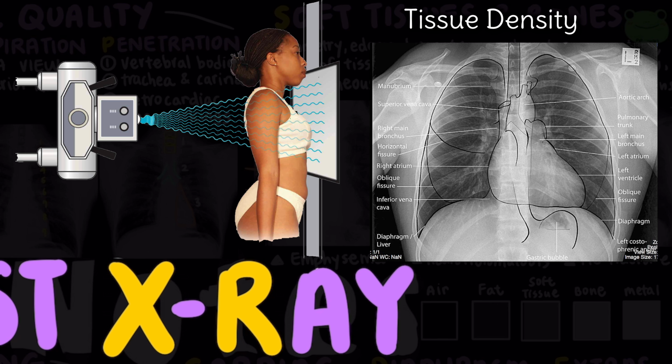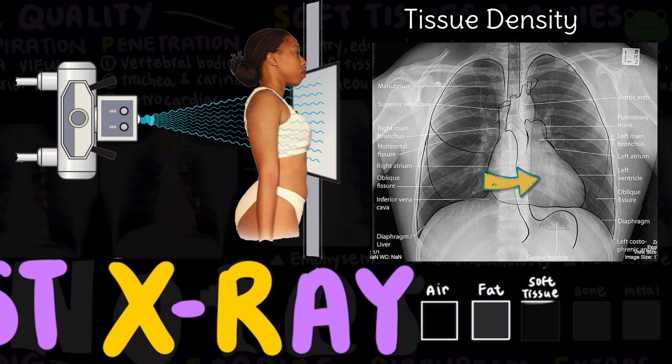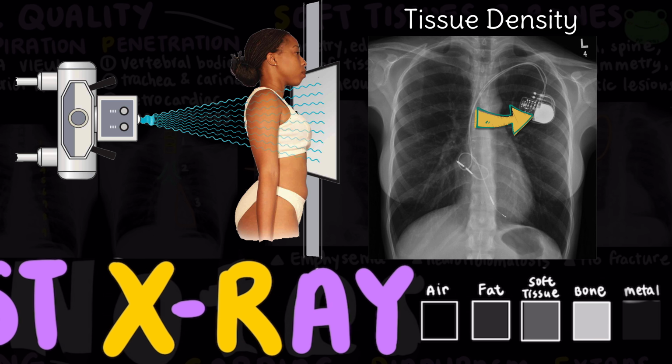Here's a quick breakdown from the darkest to the brightest. Air, like in the lungs, appears black, since it lets X-rays pass through completely. Fat, slightly more dense than air, shows up as dark gray. Soft tissue, like the heart or muscles, appears as medium gray. Bone, which absorbs more X-rays, looks white. And finally, metal, like pacemakers or surgical clips, is the most dense and appears bright white.